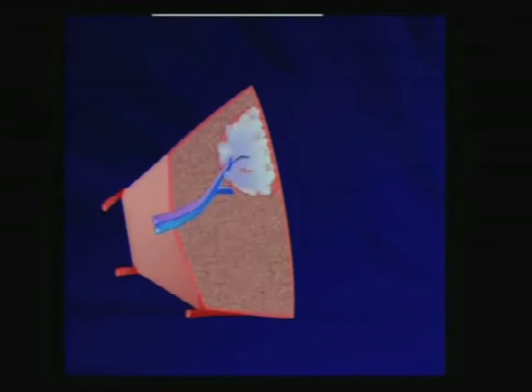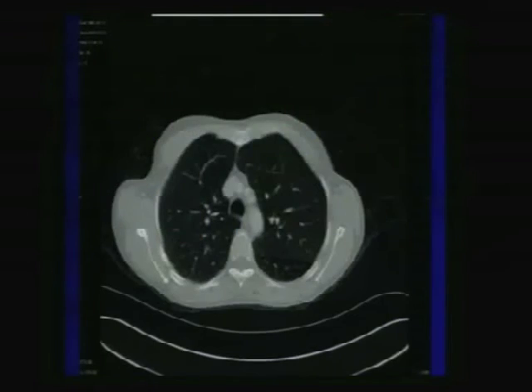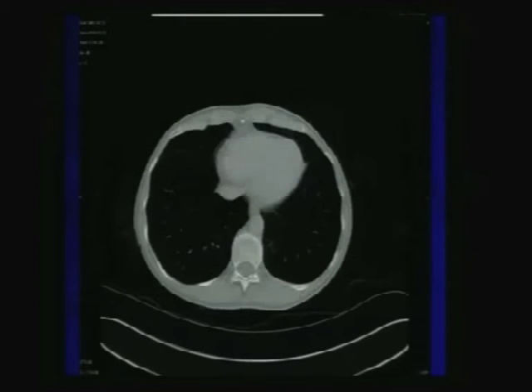Just to be complete, a patient with panlobular pulmonary emphysema, when there is more involvement at the level of the acinus and there is diffuse involvement, it still somewhat preserves the anatomy of the secondary pulmonary lobule, but it's much more diffuse. And a good example of this is a patient with alpha-1 antitrypsin deficiency, for which you can see, because of its distribution, it's more involving the lung bases in comparison to the centrilobular pulmonary emphysema, where you have more involvement of the apices of the lungs.